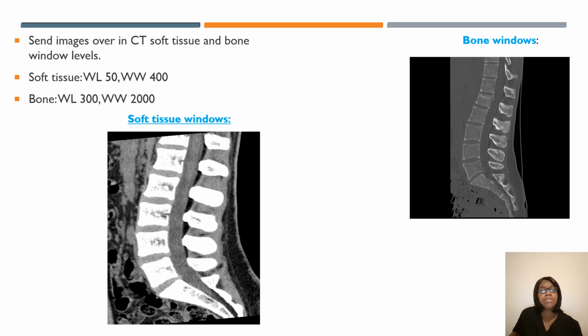Know the difference between bone windows and soft tissue windows. Here is an example of how it looks. And a lot of times you have to send soft tissue and bone windows to the radiologist.